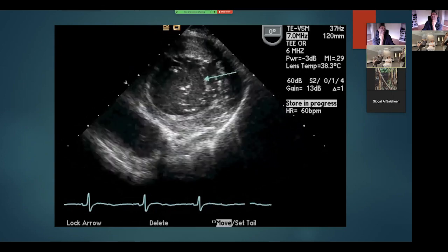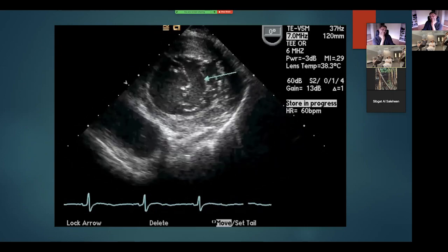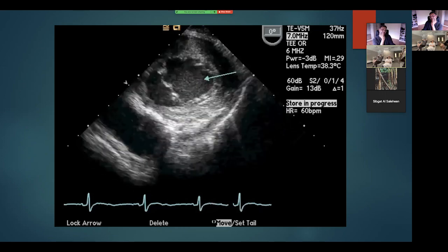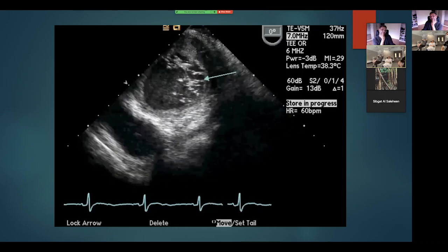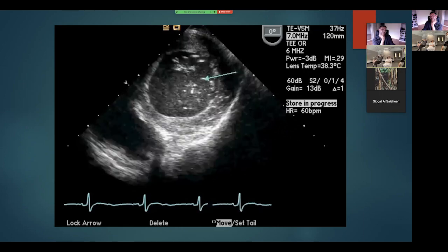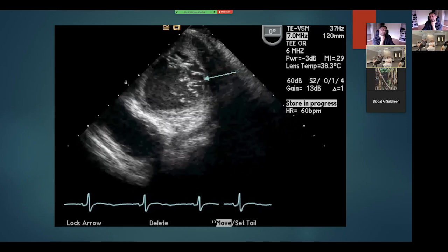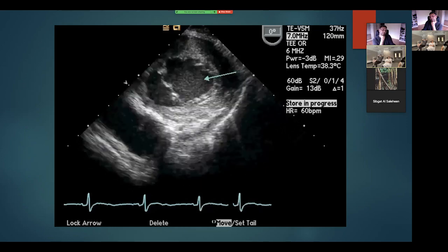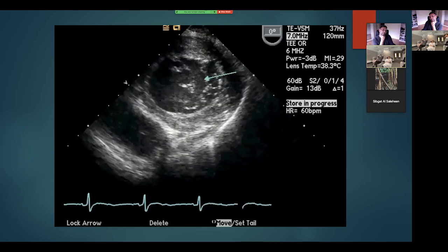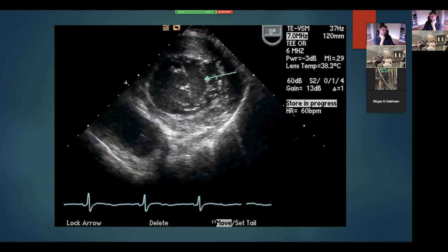Okay, so it's a TOE picture. That's very similar to Adam's. In fact, I can take an image. So the anterior leaflet is on the left and the posterior is on the right. Numbering from 1, 2, 3 is bottom to top, and it's pointing to the middle two, anterior or posterior, I'm not sure. A2 or P2, I should say.